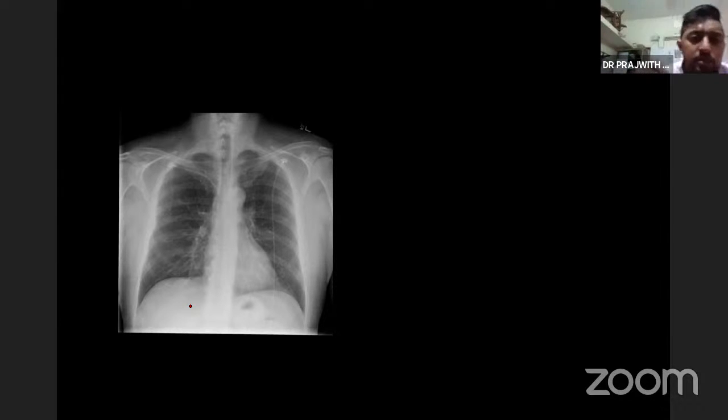Now look at this image, what we are seeing now. In this image we saw the liver here, the spleen here, the fundal gas shadow here, the heart, and the aorta. Also observe that this is the aortic knuckle, and what's going down here all the way to the abdomen is the descending thoracic aorta. Immediately next to it we can see a line, this is the vertebral body line. So this is how we can see different structures.